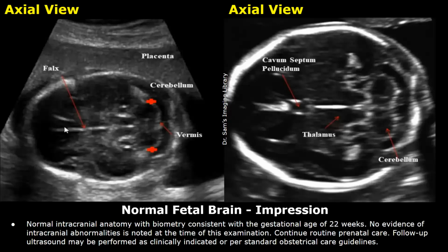And here is the impression. Normal intracranial anatomy with biometry consistent with the gestational age of 22 weeks. No evidence of intracranial abnormalities is noted at the time of this examination. Continue routine prenatal care. Follow-up ultrasound may be performed as clinically indicated or per standard obstetrical care guidelines.